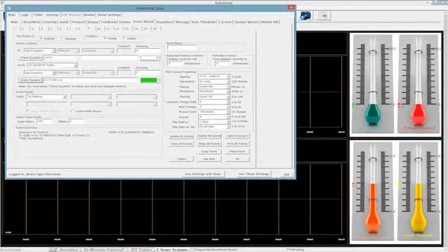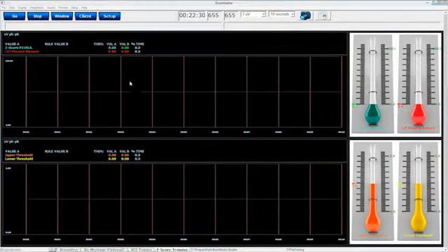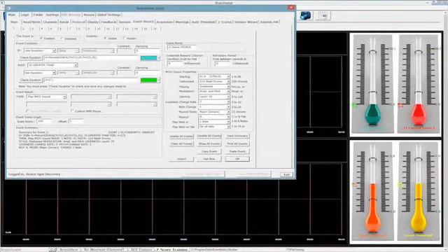And that is where a function is much better than a variable, when you're changing what could possibly be done with a variable. If you never change this right here, you stick with your standard settings and you use that all the time, are you going to probably have that issue? Probably not.